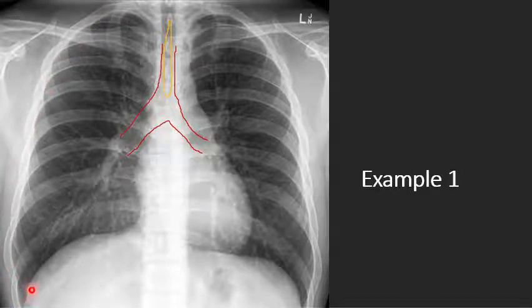Our costophrenic angles are there. They're not blunted. They don't look very deep. This one may be a little deep, but this isn't the best x-ray because the X-ray technologist needs to be able to capture until you see the bottom of it. So if you're concerned contextually that this may be a problem, then you need to evaluate for another image and say, hey, you didn't go deep enough.